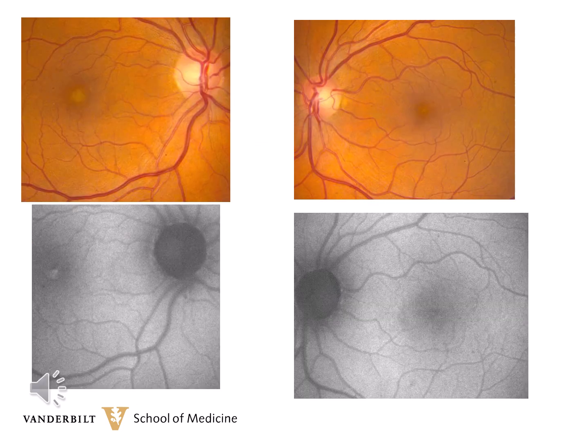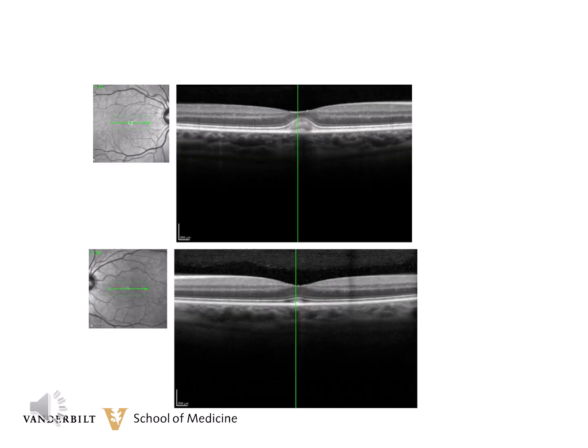This is a 57-year-old female who's on Plaquenil and referred for possible macular degeneration. Her vision is 20/40 in the right eye and 20/20 in the left eye. The vitelliform lesion is seen easier in the right eye, but the left eye looks fairly normal. The fundus autofluorescence shows a little hyperfluorescence in the right fovea, but the left eye also looks fairly good.